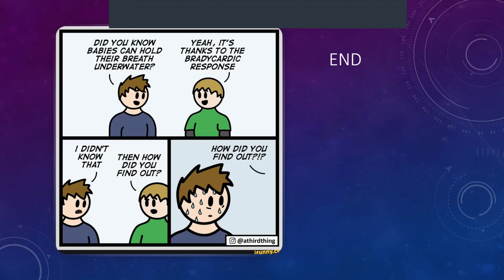And if you're confident in what you're seeing, nobody will hold you liable for that. But of course, in the majority of departments, you do have blood gas machines. They can give you electrolytes in a minute or two. And in those cases, it's always better to wait for an electrolyte reading before you decide to barrel ahead with treatment. But if you're really sure and you want to go ahead, most people would accept it if you can demonstrate your knowledge of it.